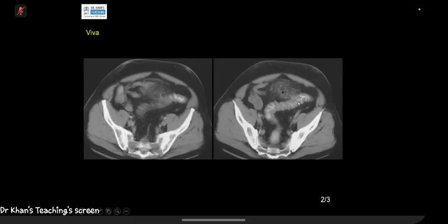So the two walls of the mucosa are sort of adherent to each other because of submucosal edema. Now with that, remember the pathophysiology. The diverticulum must perforate. The perforation can be microscopic or macroscopic. When it perforates, you will find fat stranding surrounding it. This is the key finding. This fat stranding can be with bubble of air or bubbles of air. They are within the mesentery. Usually, the sigmoid has got its own mesentery. So this is the sigmoid mesentery.